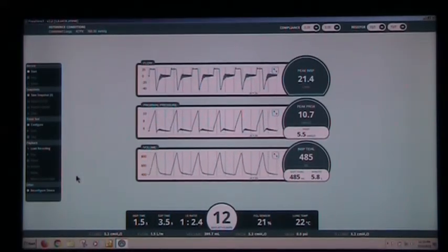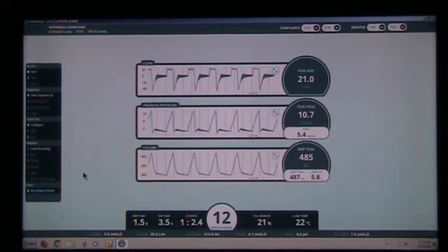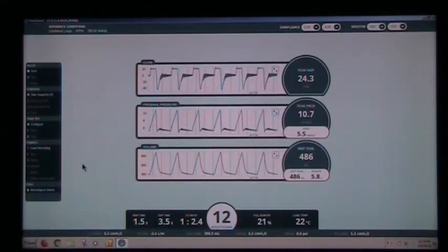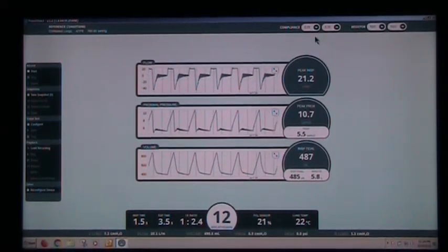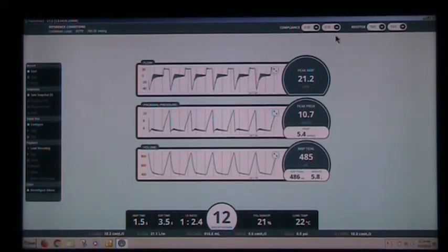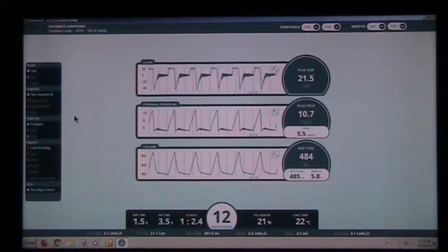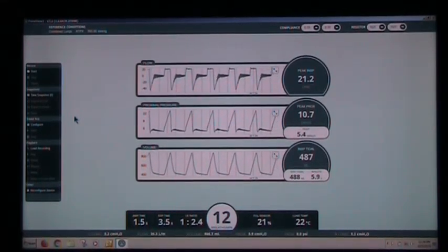So again, the 2 things to review as far as the basics of getting good numbers here is that we have to, in the setup screen, make sure we've selected the gas standard properly, make sure that we've started PneuView with 0 pressure in the lungs, and up here on the top, make sure that we have the compliance values entered correctly and matching where the compliance springs are set on the lung simulator. Those are the basics, and in a future video we'll talk in more detail about how to work with the different modes for data acquisition and saving and recalling results.